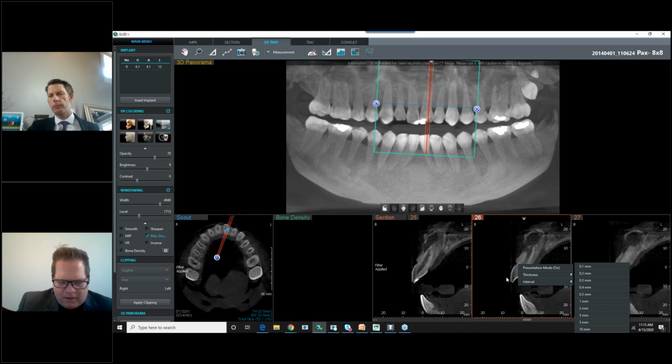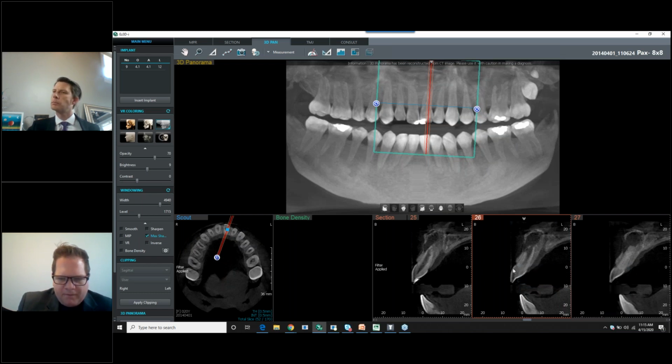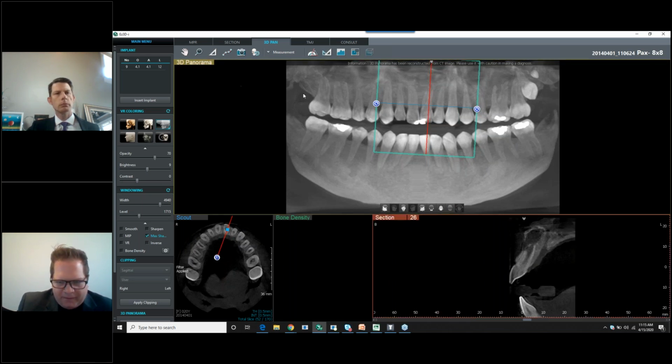So from there, we can just simply measure. We can see the abnormality right there on that slice. So we're going to measure and put our implant in. So we click on our measuring tool on the toolbar on top, and then we'll measure from the ridge to the tip there, and we can do the same labial to palatal area as well. And you can keep measuring until you want to turn your tool off and just do a right click to turn it off.